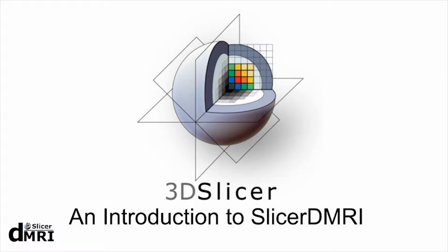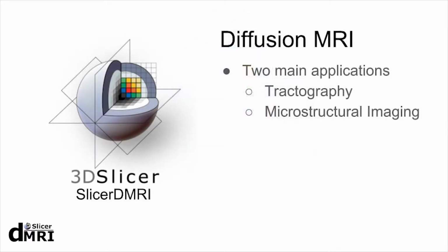Slicer DMRI is an extension to the program Slicer for medical image visualization and analysis. This extension contains modules which focus primarily on diffusion magnetic resonance imaging, a non-invasive method for mapping white matter connections in the brain. Diffusion MRI, or DMRI, has two main applications. First, tractography to map white matter fiber tracks, and second, imaging of cellular microstructures.